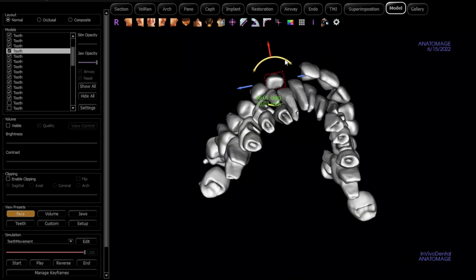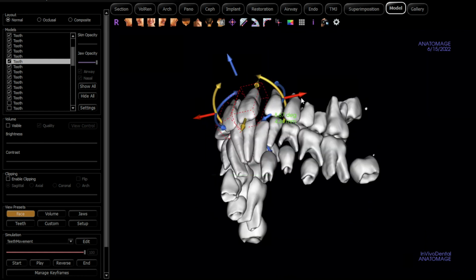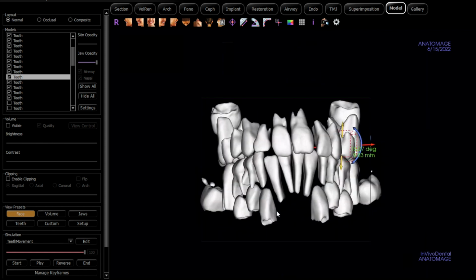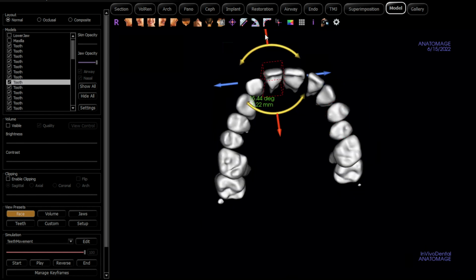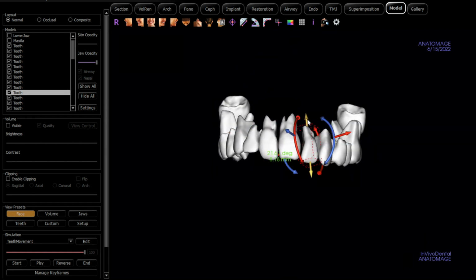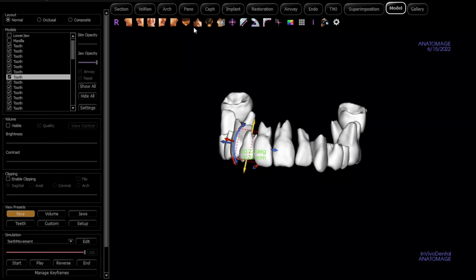So when you're looking at some of these movements, they're not too practical in the sense that if these teeth are erupting spontaneously in the positions where I'm extruding them, they're probably not going to be able to move laterally 6 and 7 millimeters. But it does help you with the directionality of where things will be erupting, given that you can extract teeth prior to those eruptions happening and let a passive eruption pattern take you in the direction of that final position.